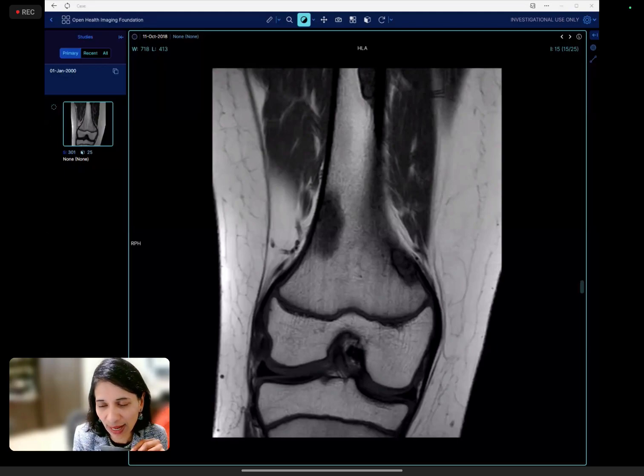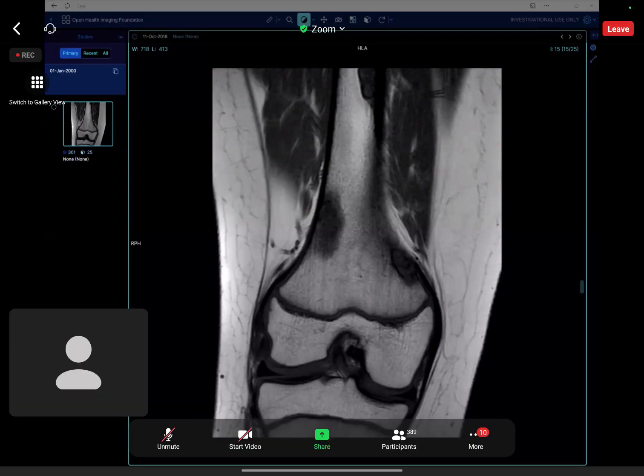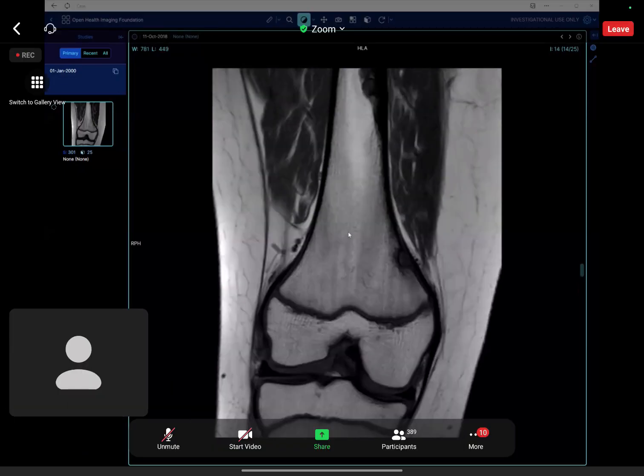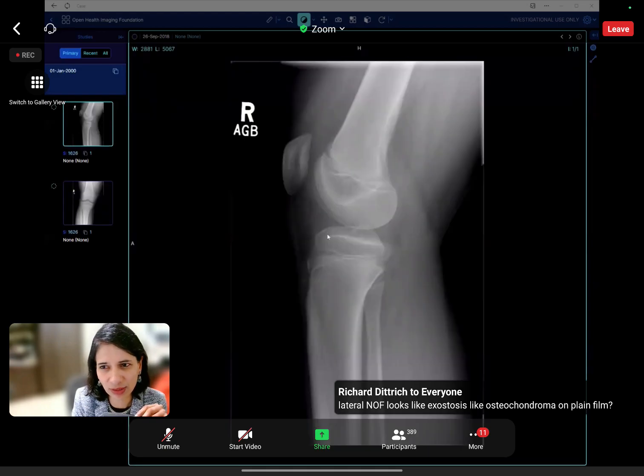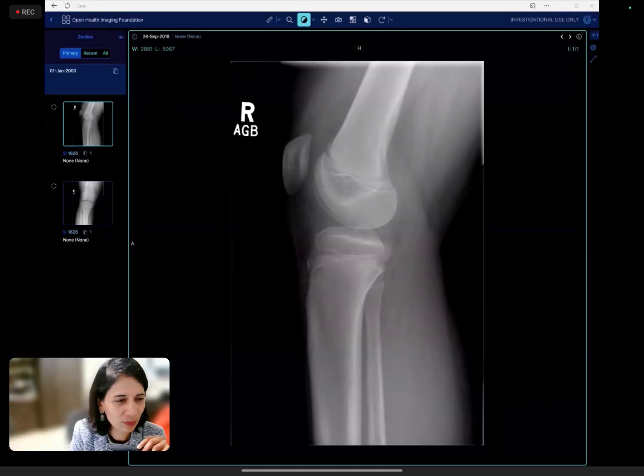That is because they can have neurofibromatosis features, like café-au-lait spots and type 1 neurofibromatosis features. But I don't think they will expect that. They just want you to identify that it is non-ossifying fibroma. That's all.